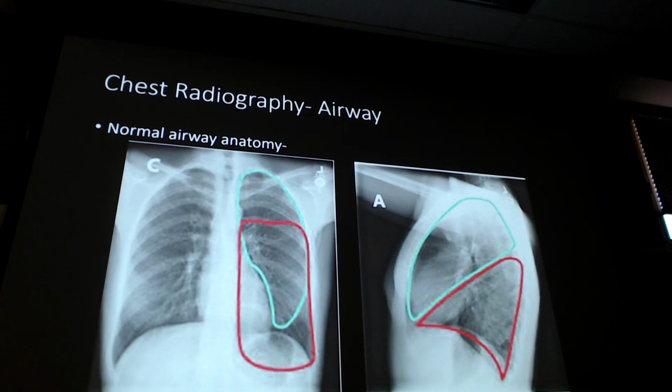And the descending aorta, yeah, it's probably both. It could be either or. There's too much overlap in those areas for us to make an educated guess of knowing for sure where it's at in that descending aorta area, and then even here in the left border of the heart. So for us, hemidiaphragm is what I care about, the left lobes.